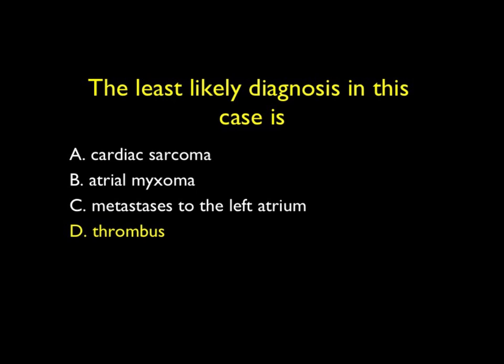This was, in fact, a primary sarcoma, a chondroblastic sarcoma. Very unusual. They said it couldn't exclude primary versus metastatic, but the patient had no history of a metastatic lesion or other primary lesion. And so this was a sarcoma. Again, nice example, showing you the lesion, well-defined, the importance of IV contrast, allowing you to see the lesion. The one thing this is not, of course, then, is a thrombus.